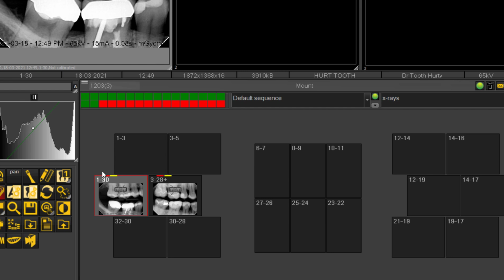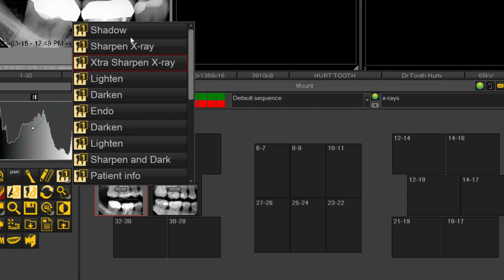Okay. Another filter tool that we have here is the big tooth with 1. And if you have these horizontal lines here, or I should say angled lines on the corner, these 45-degree little lines in the corner, you can click and hold on that icon for a couple seconds, and it means that you have multiple choices in there. So these are all those filters that you saw from that A button in the prior X-ray acquisition aspect of the video, and these are all the ones that can be programmed.